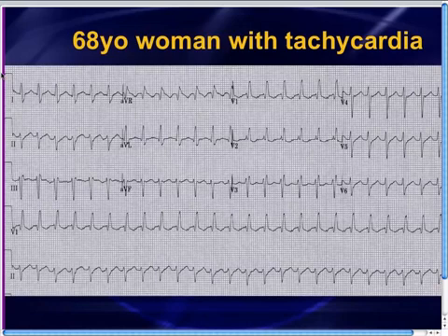Can a 70-year-old woman have a sinus tachycardia with the rate of about 150? Well, it's pretty close, it's borderline, but she probably can. Generally speaking, how fast can your sinus node beat? We've seen neonates that have sinus tachycardia of 200, and a 70-year-old is never going to develop a sinus tachycardia of 200. Generally speaking, what they say is that you take 220 minus your age, and that's how fast your sinus node can beat.